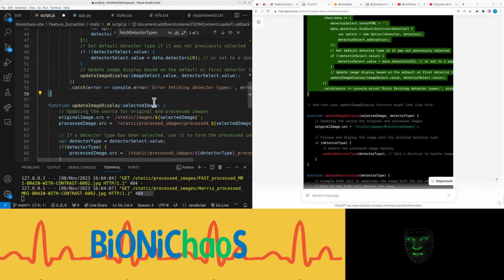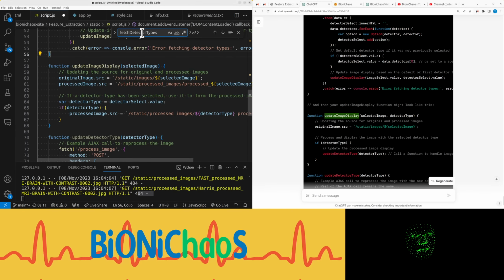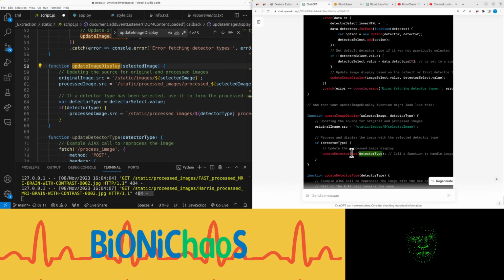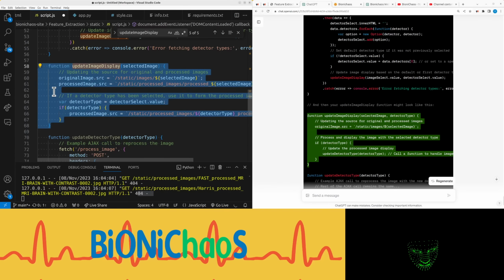And then function update. Don't have it, do we? No, we do. And select image detected type. Yeah, okay, this should be better. We haven't tried the previous one, so I'll just use this one.